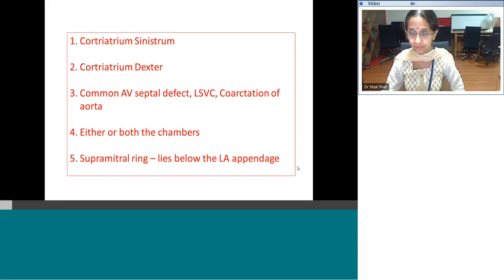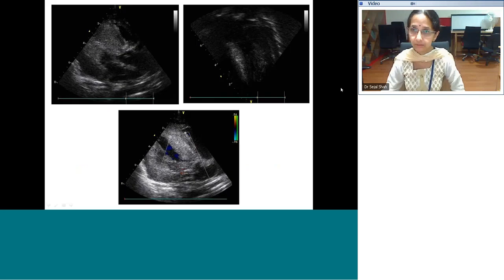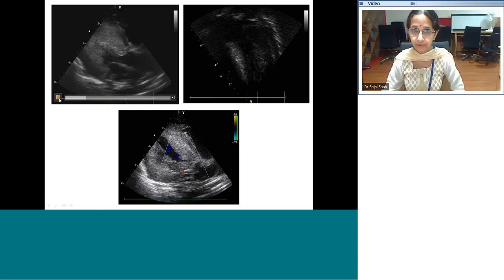So now let's go to the third question. This is going to be an easy one as much as the diagnosis is concerned. However, we are going to go into a little more of echo peculiarities.